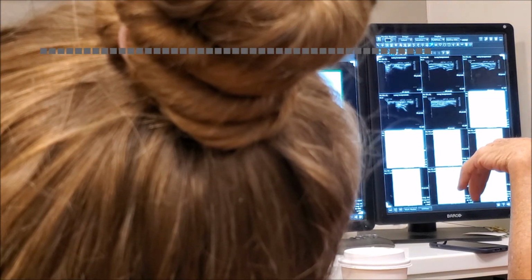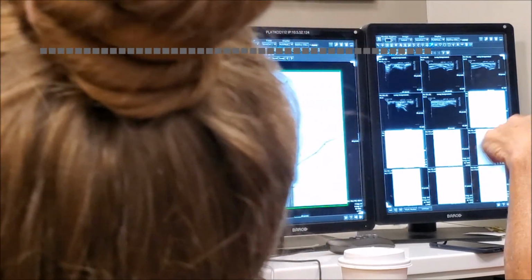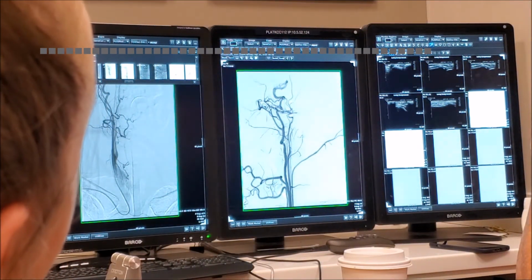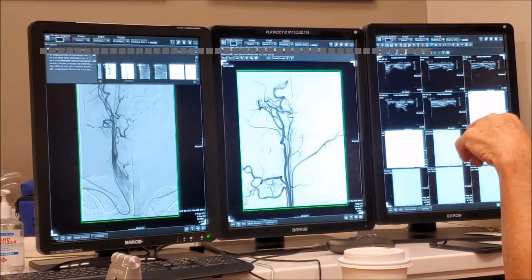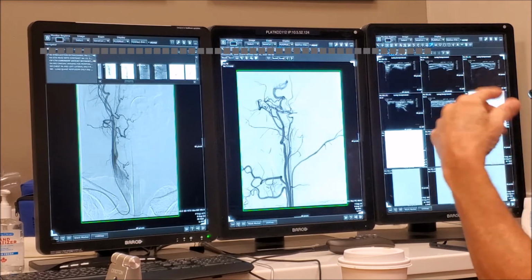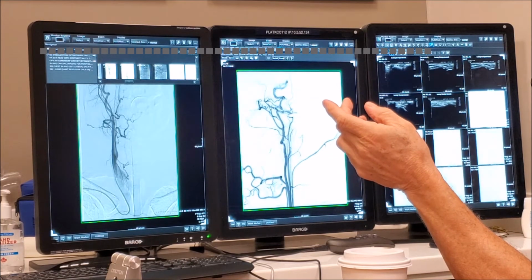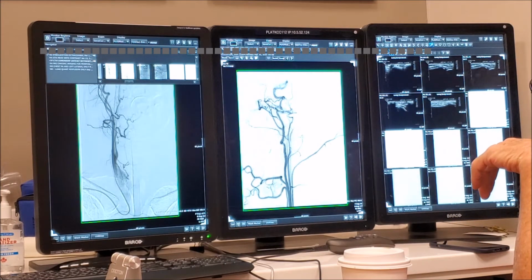The superficial temporal artery comes from a deep position, and it goes through the zygomatic arch right here. So when you get this curve, I can identify it. Remember, foramen spinosum helps me to identify the middle meningeal. This curve of the mandible helps me identify the superficial temporal. Okay, so if I have the superficial temporal here, oh, this is another. Look at it.